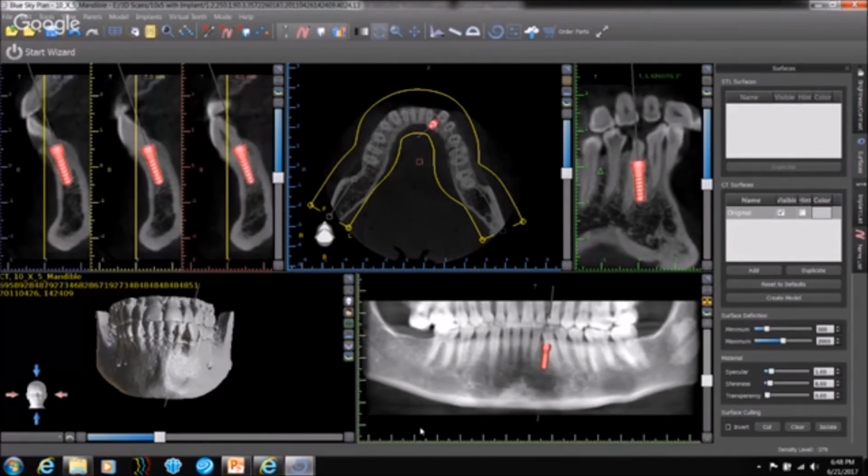Okay. Another question that came in: why are we so close to the nerve? Why not angulate more lingually and stay 4 millimeters away with a smaller implant? It is a matter of choice. Please do not use this as a template for implant planning. I just picked something for the sake of demonstrating the tools that are present, and the type of things that you need to keep in mind while doing it. So you're right. It could be close. It could be away. It is totally up to you. I apologize if I was sending any mixed messages there, and thanks for pointing that out.